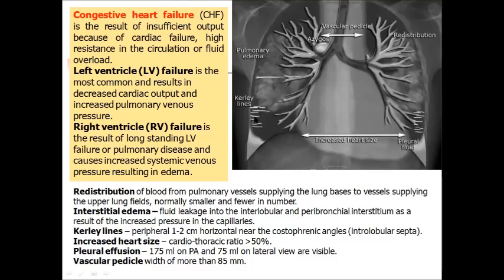It's the image of interlobular septa, which become visible as a result of interstitial edema.